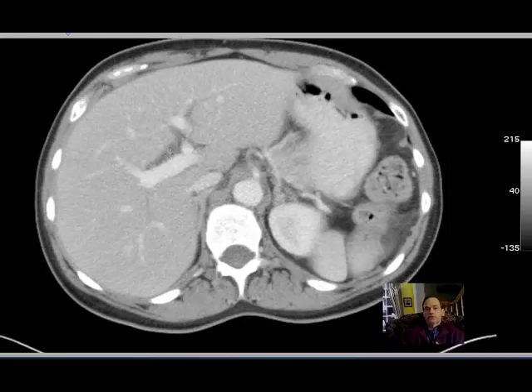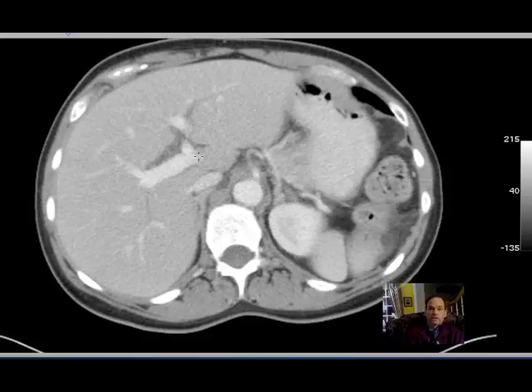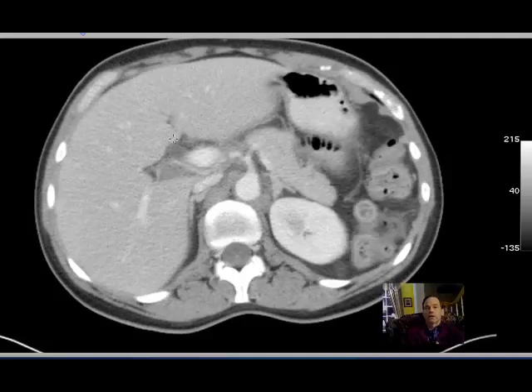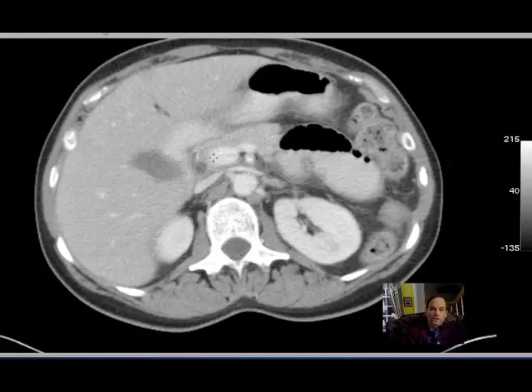The biliary tree converges and drains toward the pancreas, and it's at that same point that the portal vein is coming in and branching out to the liver. So these lower attenuation areas are the biliary system converging here, continuing as the common bile duct, which goes into the head of the pancreas, is generally joined by the pancreatic duct, which is very hard to see here.